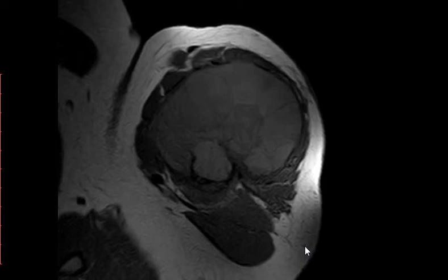Telangiectatic osteosarcoma, I'll give you that. However, you cannot have a telangiectatic osteosarcoma this big without invasion of any structure, and multiple fluid levels without a soft tissue component are not in favor of telangiectatic osteosarcoma. Third, he's 27 years old. This is not the age of osteosarcoma. Osteosarcoma occurs in much younger patients, except in patients with what? With Paget disease, which is much older, like 60, 70 years old. They will have secondary osteosarcoma.